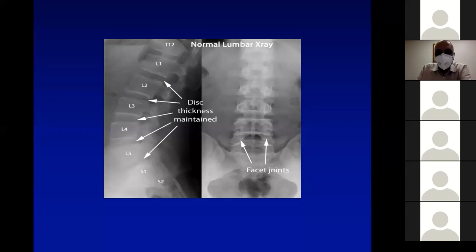These are lumbar spine X-rays, and again, these are identified lumbar vertebral bodies right up to S2. This is an AP view, and the arrow indicates the facet joints, right? This part is the sacrum, as it is labeled as S1 and S2, and this part on the AP view is the sacral part, which is being joined by the two innominate bones forming a pelvis.